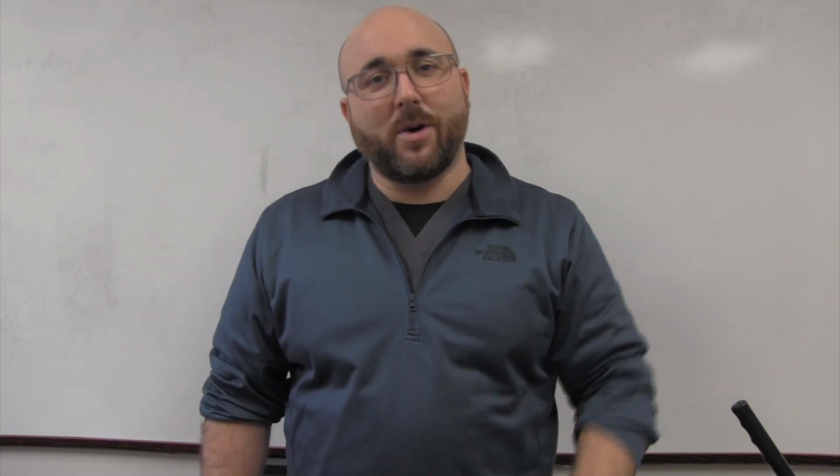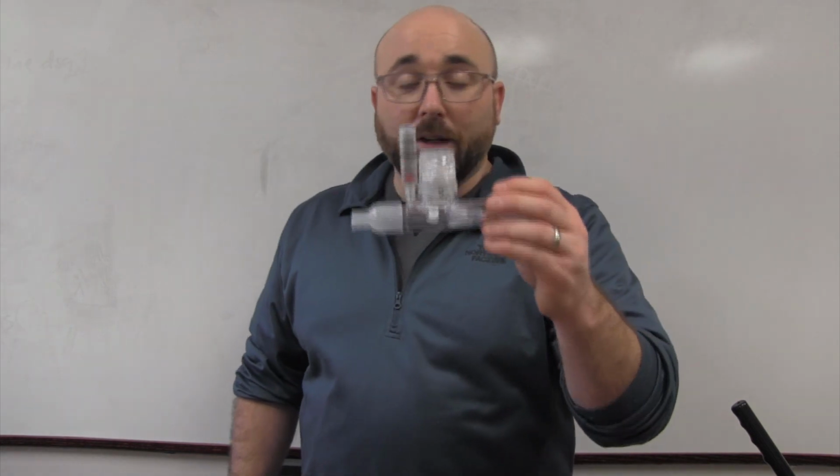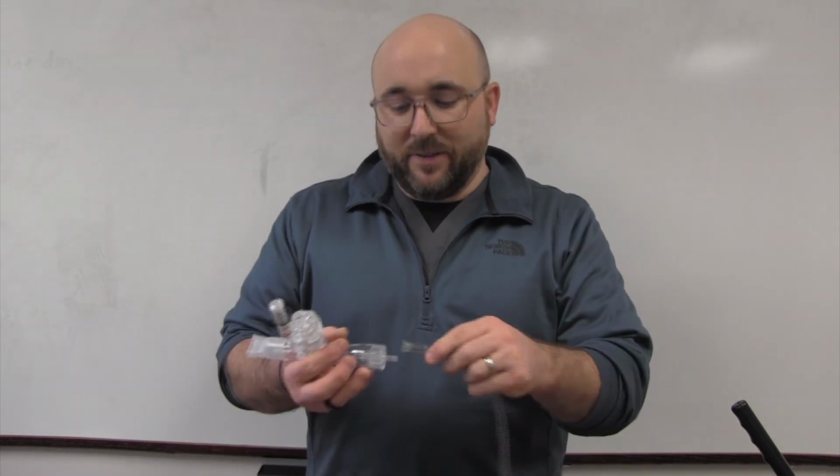We say 10 times per hour with this. I usually tell the patients to do it 3 or 4 times during commercials if they have TV on, which they all do, because there's nothing really else to do. So I tell them 3 or 4 times, but I make sure if I leave it hooked up, it's kind of loud, which is kind of a bummer.